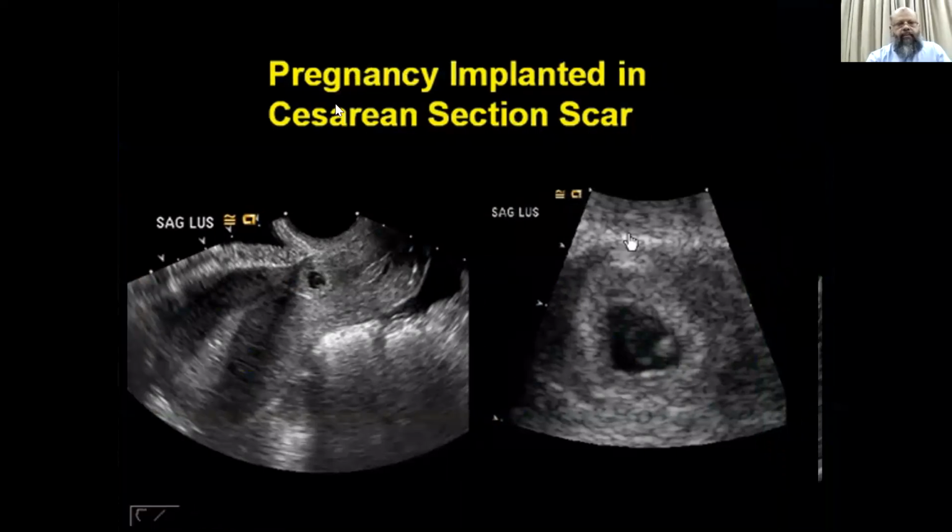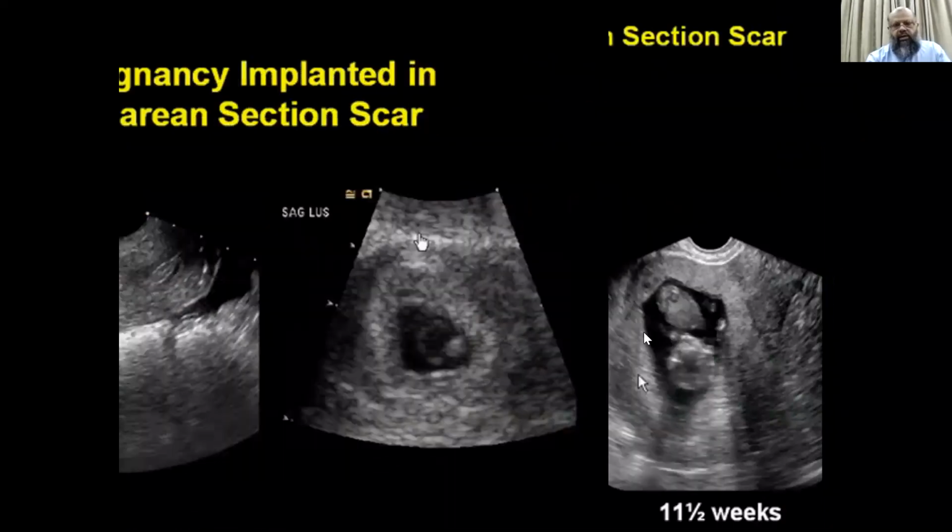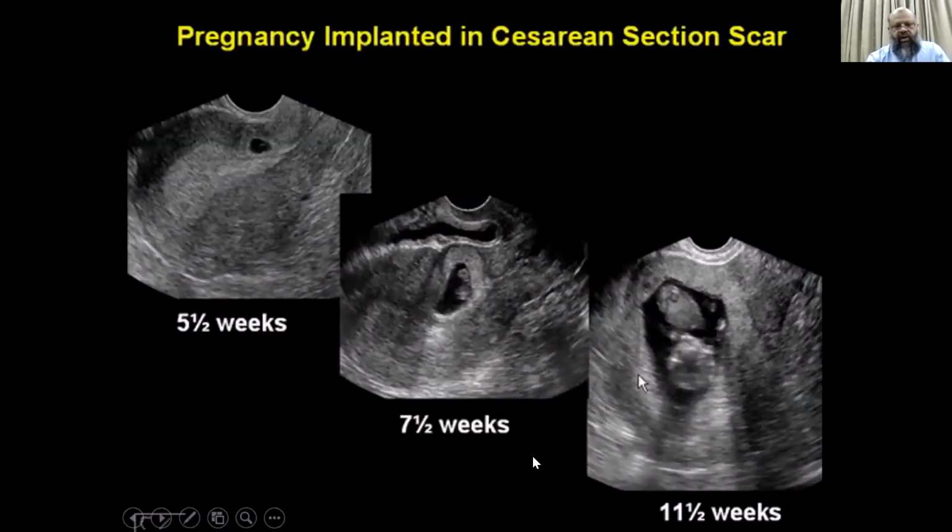Another pregnancy implanted in a cesarean section at 5.5 weeks, 7.5 weeks, and 11.5 weeks.